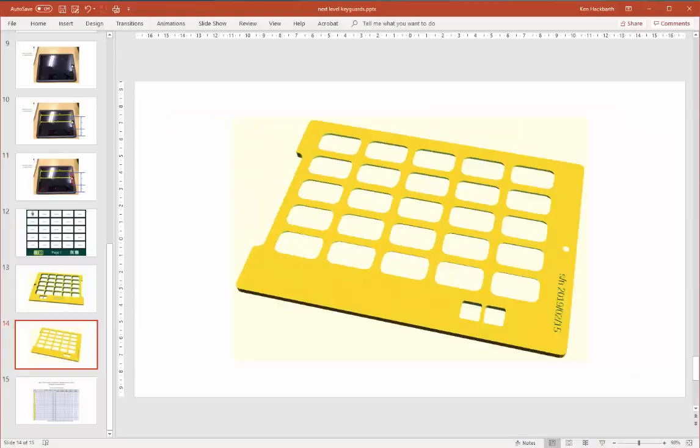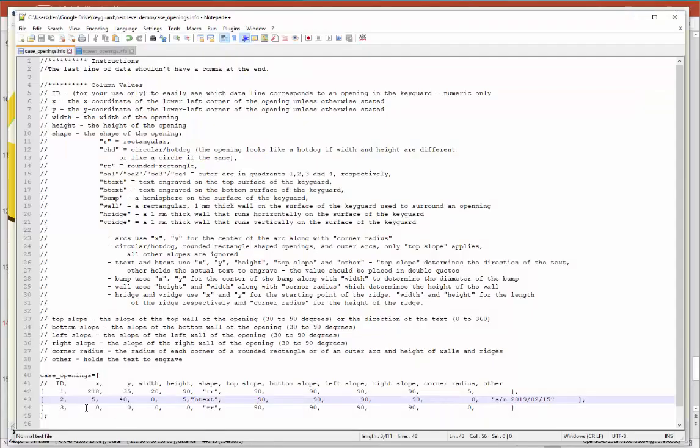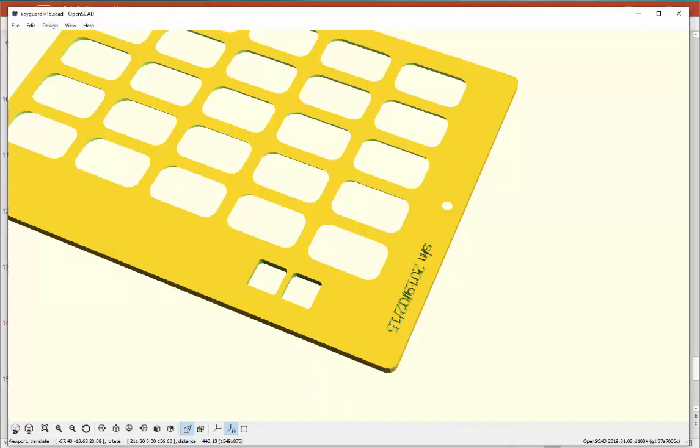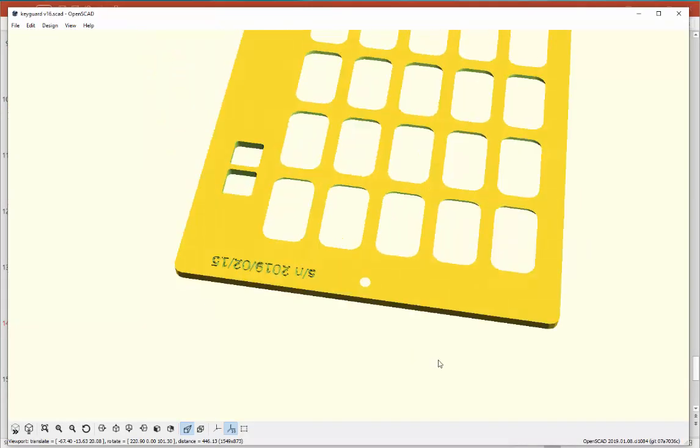So now it's positioned kind of where we want, but we need to get it further in, make the X dimension larger, and I believe need to make the Y dimension larger as well. So let's double that X dimension, say 10, and let's take the Y up another 20 to 60 millimeters, and save. All right, now it's looking pretty much like what we wanted, right?